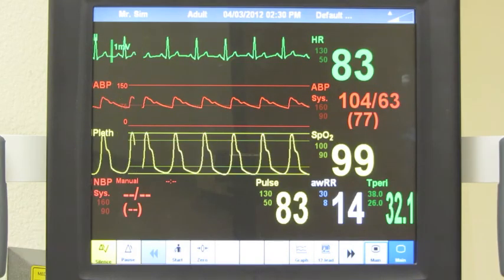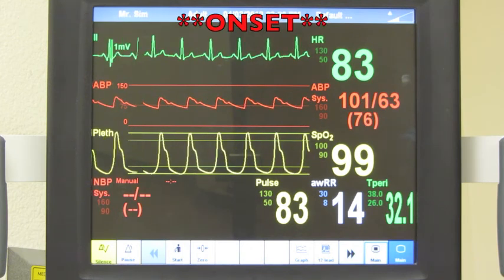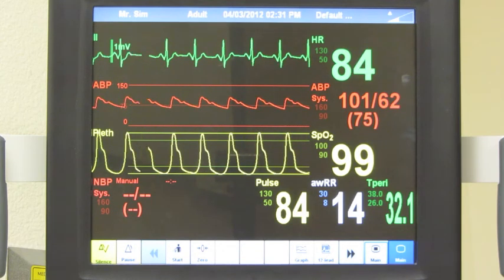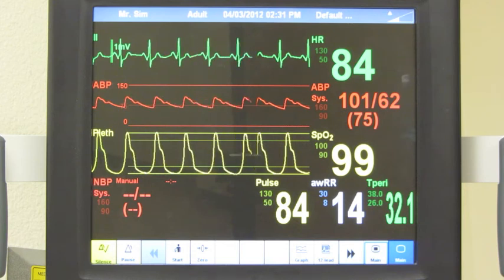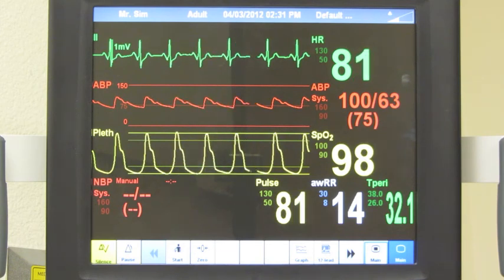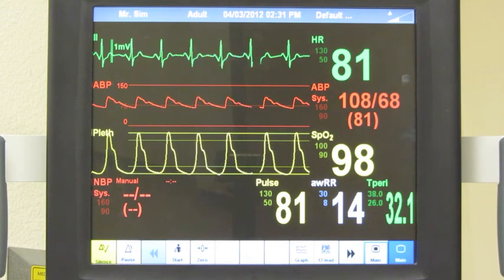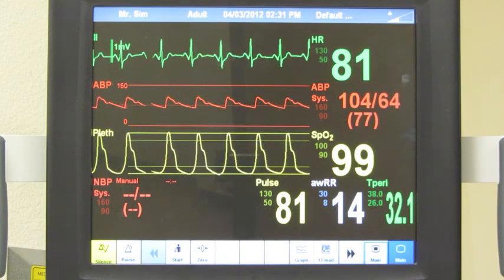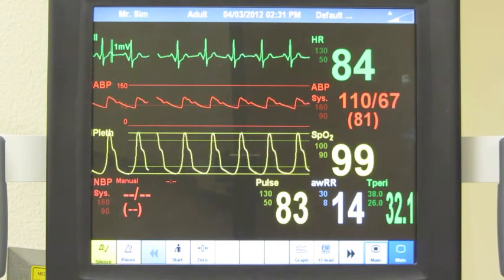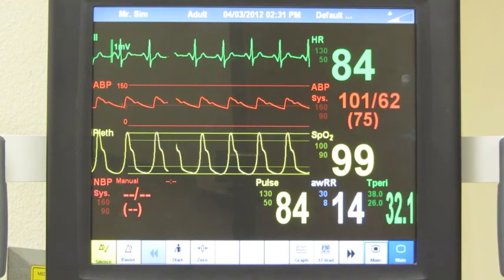You see on the screen before you now an example of ST segment depression. I want to remind you that ST segment depression consists of a horizontal or downward sloping ST segment that's depressed for at least 1 millimeter or more and has a depressed duration of greater than 0.08 seconds, or 2 small boxes if those were on the screen. The depth and duration of depression is proportional to the degree of ischemia that the ST segment signifies. As a new finding, ST segment depression should be a cause to discontinue the physical activity you're currently involved in.